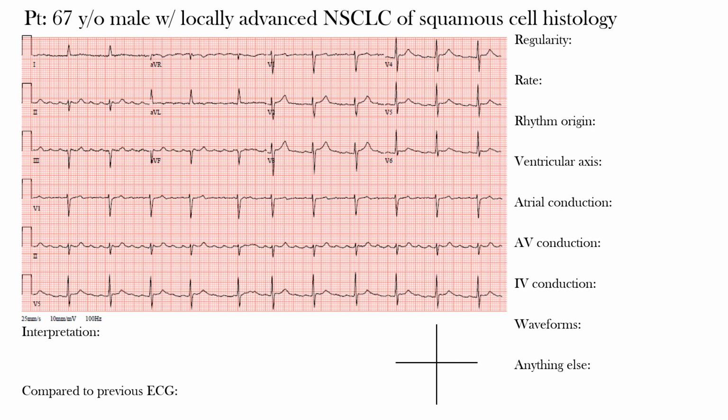But the beats that follow that delayed beat occurred where it is expected to, such that if you were to measure that, it would come out to 2 times the regular R to R interval. That beat occurs where it would be expected, and we'll look at that shortly. Okay, so this is similar to what we would see in escape beats. So overall we would call this a regularly irregular rhythm. We can write that up here. Regularly irregular.